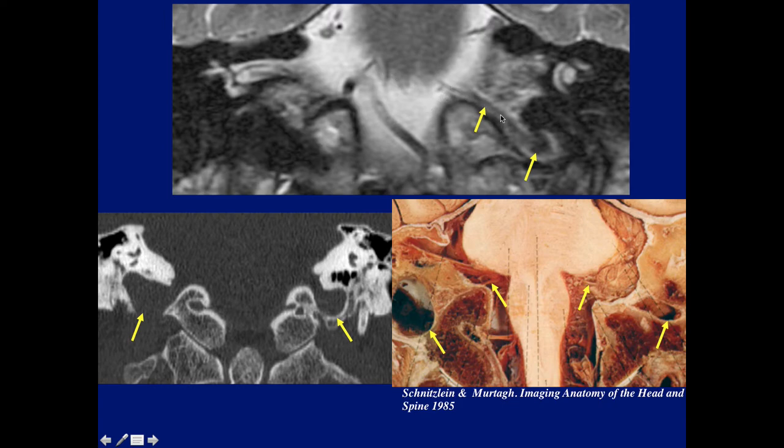For instance, here's a nerve going into the jugular foramen, and we can see it on the specimen just a little bit here. Again, the jugular foramen. Again, a little bit of the nerve, and here's a large jugular vein. So again, on the coronal CT, this is the area of the jugular foramen. But remember, because the slices are very thin, you are rarely going to see such a nice view of the entire nerve. Usually you'll get pieces of it as the slices are very thin.